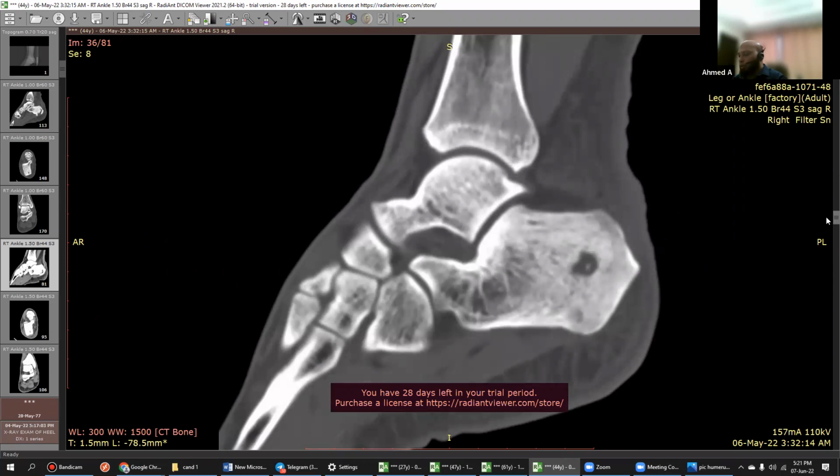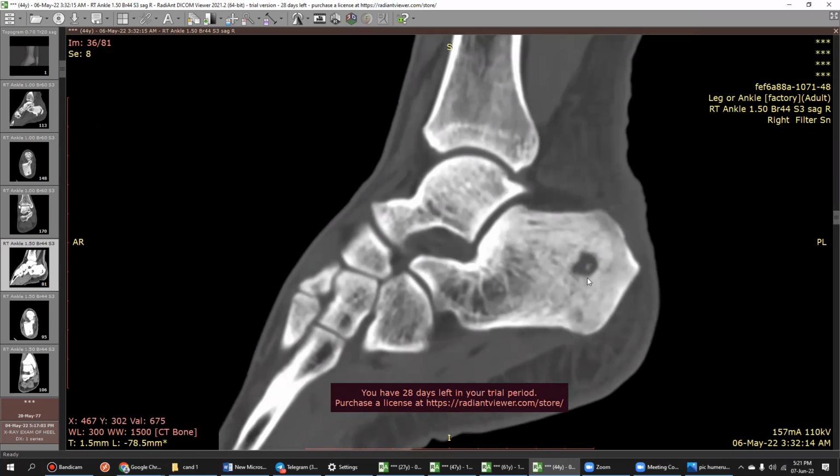So what are the three things you have to show when you link chronic osteomyelitis to the examiner? Yeah, so I will relay these findings and will recommend. No. Show me what are the three features of chronic osteomyelitis. What we see is the sequestrum in the middle, and the involucrum and surrounding sclerosis, diffuse sclerosis, and there is no active infection around in the soft tissue.